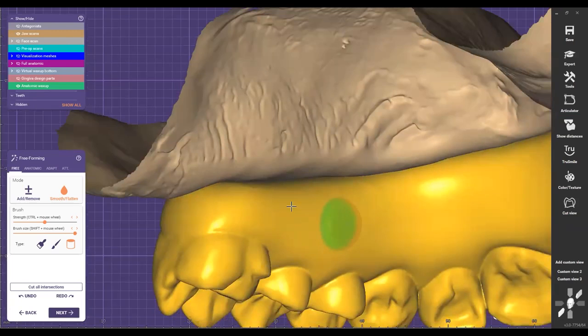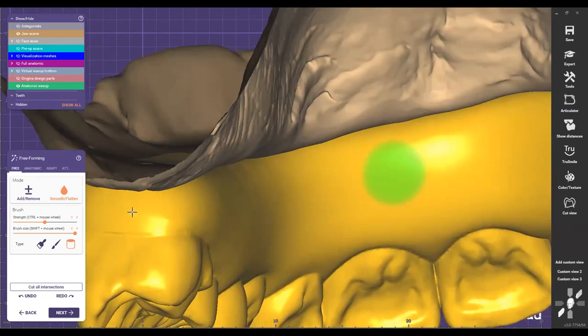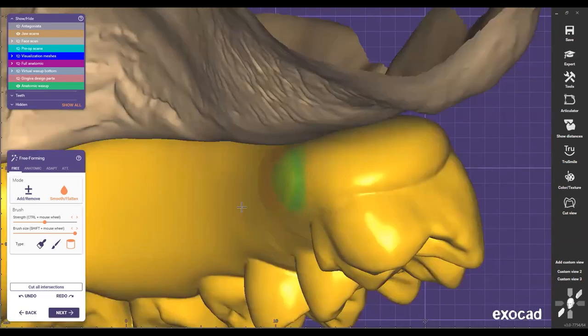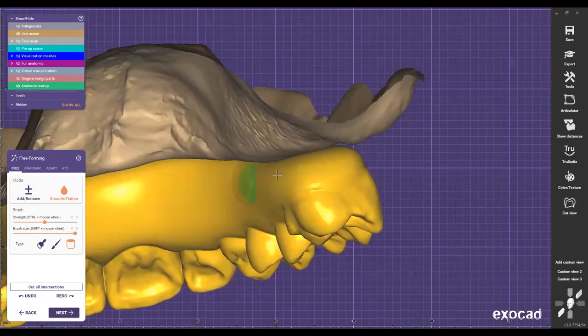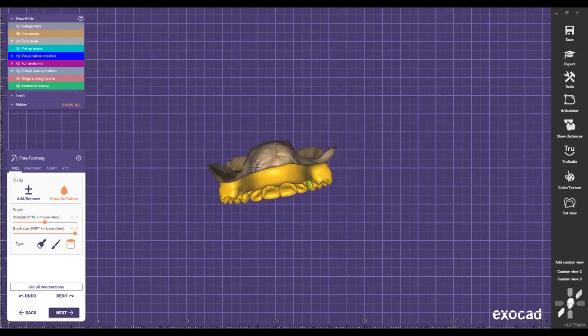When I come to the lingual, I want to make sure it looks nice and smooth and flat. So something here, and then see this bump area. I just try to get rid of those areas, and here too. So I see it from different angles, and I'm like, okay, looks beautiful there. I'm just going to wait now for this one.